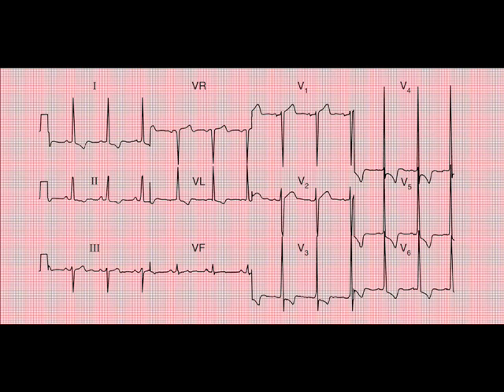We don't cover that in this workshop, but that's something you may want to hopefully be motivated to go and have a look at. We then look at the chest leads, and we see they progress from negative to positive. Very positive in V4, V5, V6. You notice how those R waves blur with the complexes above them. Now this is significant. If your calibration is correct on the far left and your box calibration is 2 large squares high, then your R waves are a true reflection of the electrical activity within the patient.